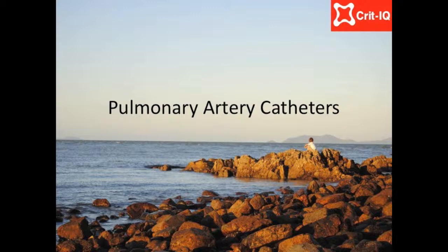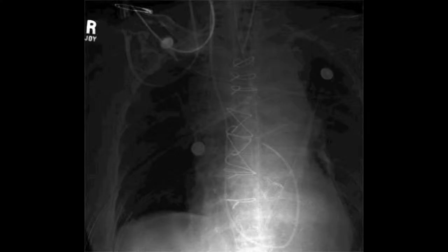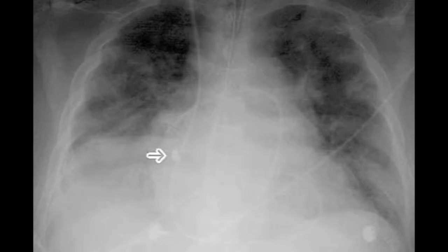While used less now than in the past, pulmonary artery catheters can occasionally be seen in clinical practice. The tip of the catheter may occasionally migrate distally, which increases the risk of pulmonary infarction or pulmonary artery rupture. Ideally, the tip should not sit more laterally than 3 cm from the midline of the chest. However, radiography rarely detects distal placement if clinical signs of this are absent, and many authors now do not recommend routine X-ray monitoring of position.